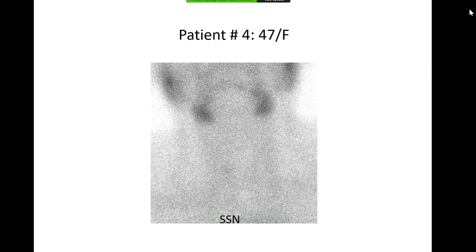It would be some kind of acute thyroiditis. Hashimoto's is one form of thyroiditis, but this would be some form of acute thyroiditis. So no uptake in an adult patient. Again, remember, clinically they would also have neck pain. They may have fever. They would be a bit tender to palpation on clinical examination, which the other causes that we discussed earlier will not be. So the clinical picture is important. That is a very classical picture of acute thyroiditis.